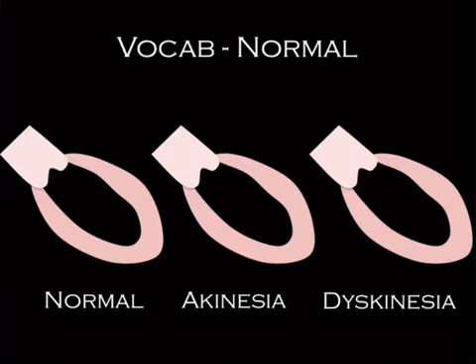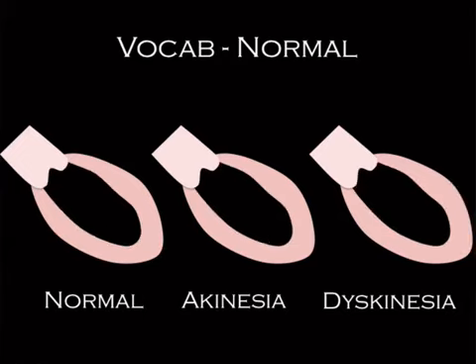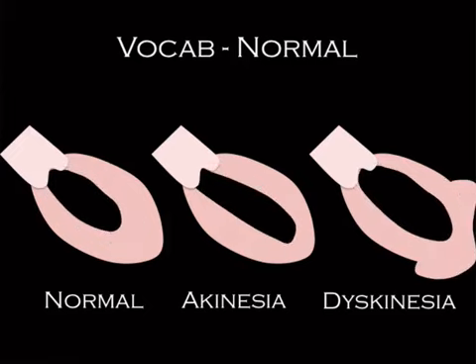So the next one here is just a little bit of vocab, and the way that this would be shown, if they were going to ask you, would be in one of those dynamic cine SSFPs where it's showing the heart pumping. Normally, during systole, the myocardium will thicken, and it should thicken here, here, and here. All the parts of the heart should thicken. See that? Just look at the normal one for me. See how it's thickening the whole way around?